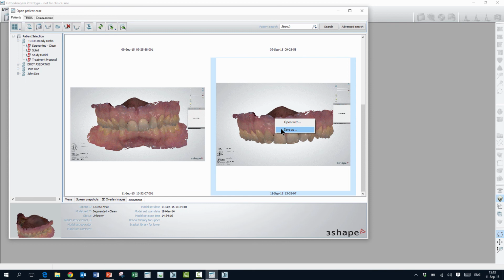The final thing I want to show you is how you control the length of the animation file. So the Ortho system ships with an animation length of 10 seconds, no matter how many steps you have in an animation file. And I'll show you where you can change it, and you probably guessed it's in the control panel. So let me just open that right now.